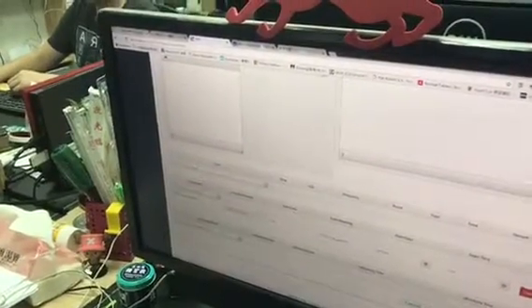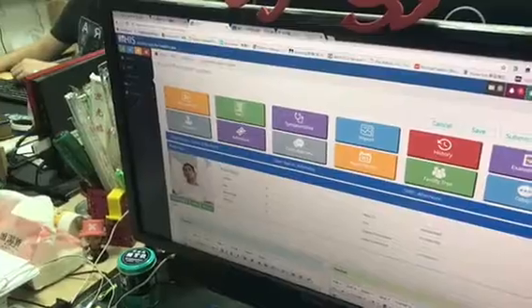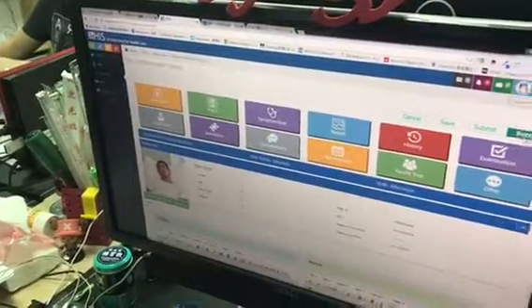So suppose this patient has to do this kind of health checkup. So you can also add some more if the doctor thinks there is a necessary test they have to do, then they can also add it here. All right, so let's just pick one and then save. All right, so after that we will need to print out the order sheet.